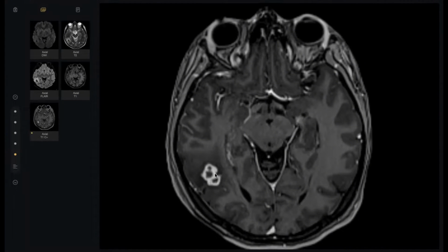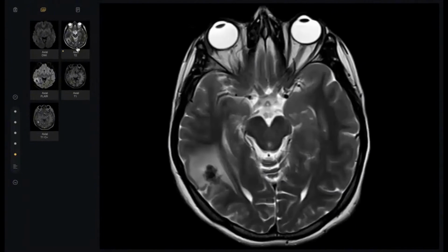The patient has cough and chest pathology, has ascites, and has this peripheral enhancing lesion. So, sir, it can be some infective lesion, most probably tuberculosis, leading to peritoneum, lung, and tuberculomas in the brain. Excellent. Look here, my colleague. This is a low T2 center, very characteristic of tuberculoma.